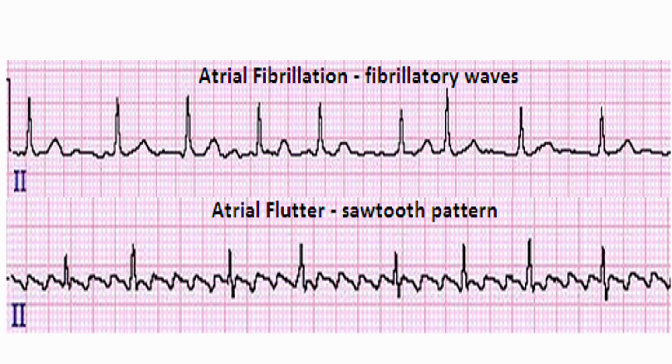Remember, fibrillate is to jiggle or shake, like Santa Claus. In the top, you can see there aren't really any good firm P waves. That might be one. I don't really see anything there. That's very strange. There's not just a P and then a T. That looks like a T and then maybe a P and then nothing else. Jiggle, jiggle. There's really nothing there. T wave. Oh, there's not much.